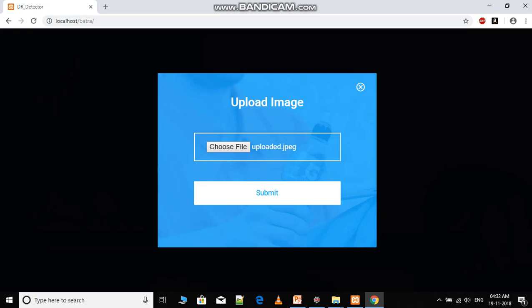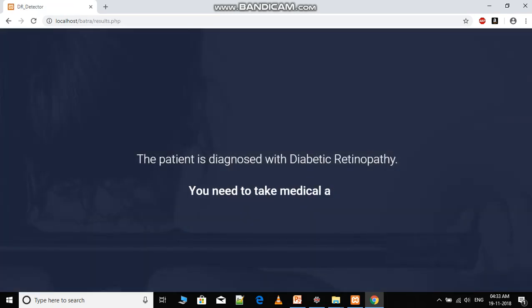Let's see. Well, it turns out that this particular user is diagnosed with diabetic retinopathy.